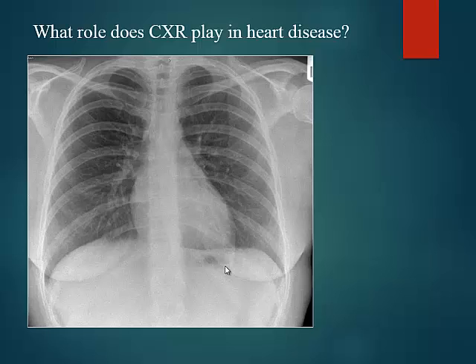Heart size and evidence of pulmonary. Okay, so that's a patient you want to assess what? Whether the patient has heart failure or not? Yeah, by way of looking at pleural effusions on the chest X-ray, by means of looking at pulmonary edema. So we're trying to say, does the patient have heart failure or not? Okay, so that important use of chest X-ray, that probably I would think is the most important and perhaps the most widely used indication for a chest X-ray in clinical practice in a hospital.